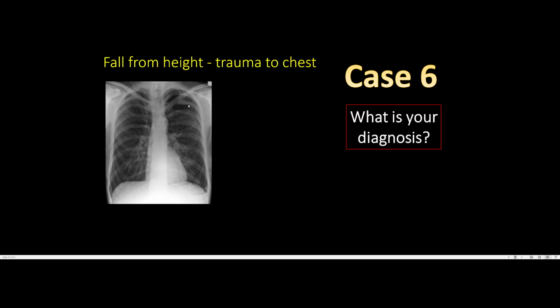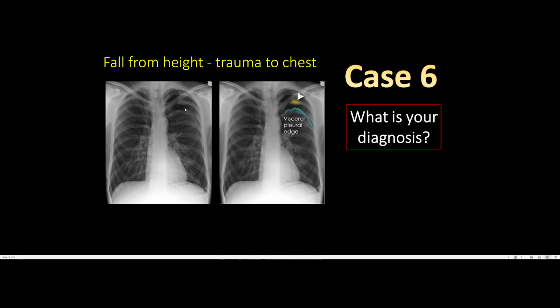There's air within the pleural space that's compressing this poor left lung, and therefore we're assuming that this patient has simple pneumothorax. We will not say tension pneumothorax. Why? Because there's no shifting of the mediastinum. And also, oftentimes tension pneumothorax does not require imaging for diagnosis. All you need is clinical diagnosis to diagnose tension pneumothorax. So this is a case of simple pneumothorax to be more than likely the case.